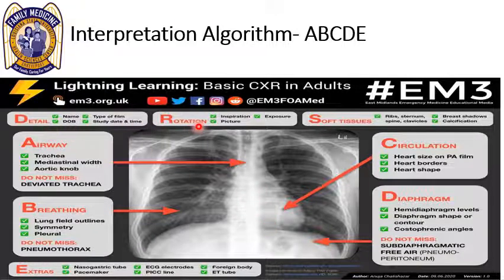So make sure that your rotation is appropriate, that your exposure is appropriate. You want to be able to see all of the lumbar, thoracic, and cervical vertebra through the x-ray here. And if you have over or under exposure, you can manipulate it a little bit with the PACS system that we have in the chart, and that might be able to help you a little bit more. But remember, if your initial shot is not very good, then your interpretation may also not be very good.